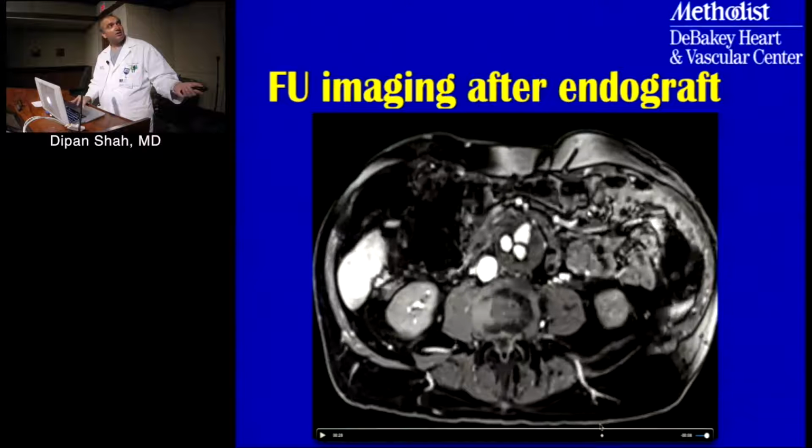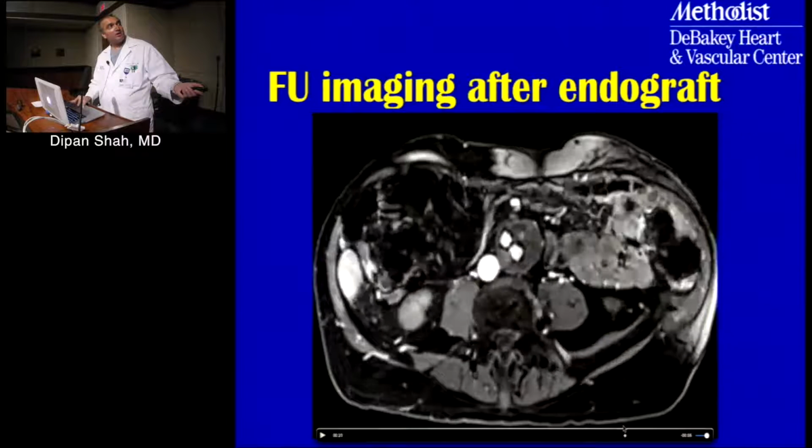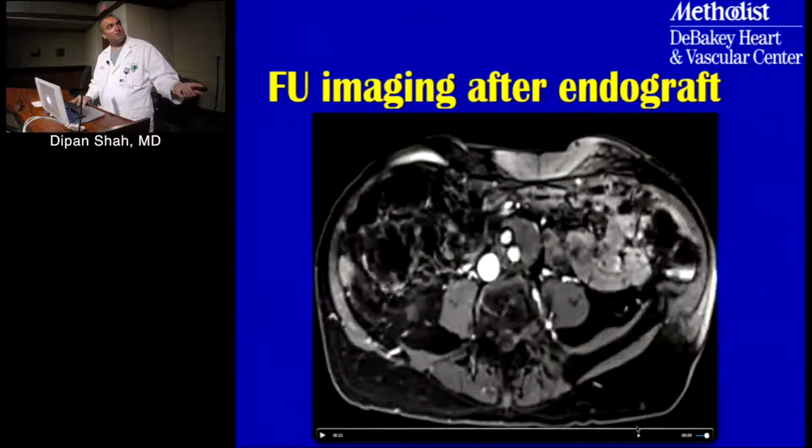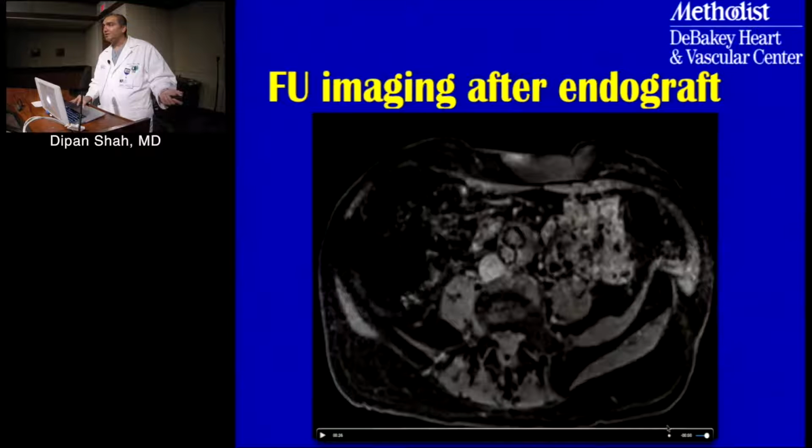There's something here, okay? Okay, so we've made the diagnosis that there's an endoleak present, right? Does that mean this guy needs to go back to the lab? Okay, not necessarily. So what is your decision making based on? Okay, so what are the types of endoleaks?